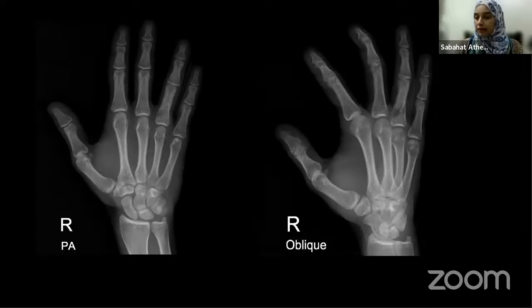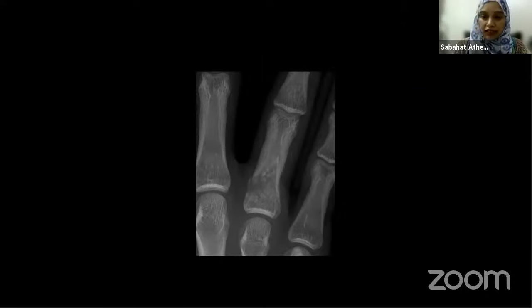Going to the next case. This patient came with pain. What he has pain, let me show you. He has pain in his right fourth finger. So if you cannot see the pathology immediately, you go systematically, okay? Anyone has found anything? Right fourth finger. Okay, maybe it's a projection. Let me give you a close-up view. Now tell me what is happening here.